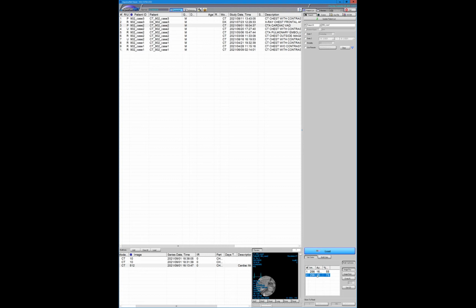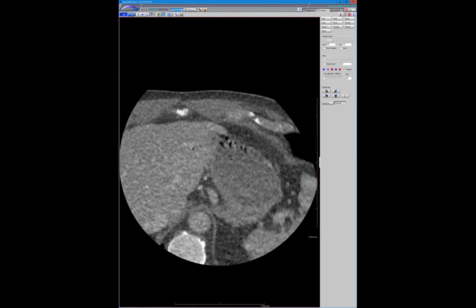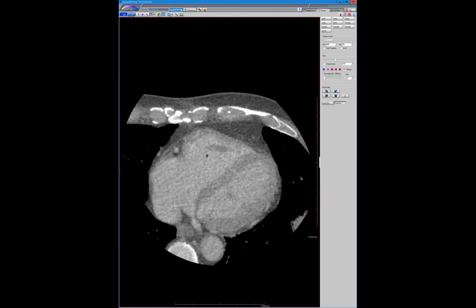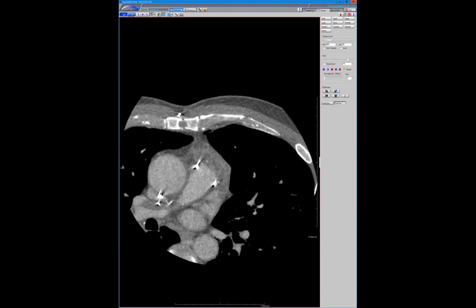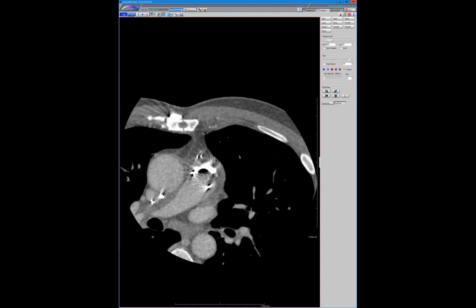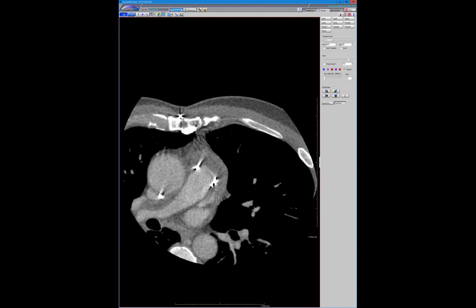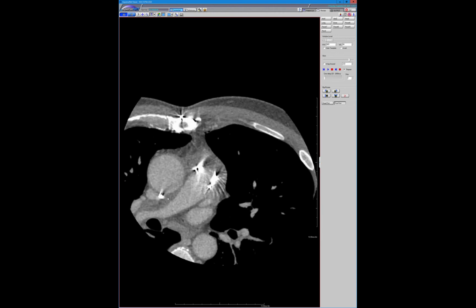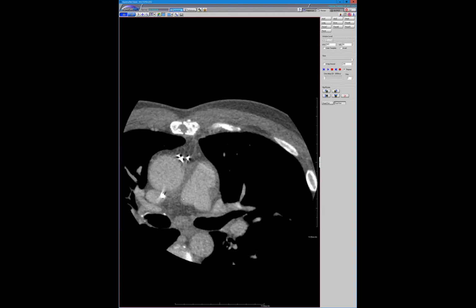So you can see that now there's all this soft tissue in the region of the pulmonary valve where they replaced the pulmonary valve. And not only that, there's all this soft tissue growing along the RPA into the pericardium, into the superior pericardial recess and around the SVC.